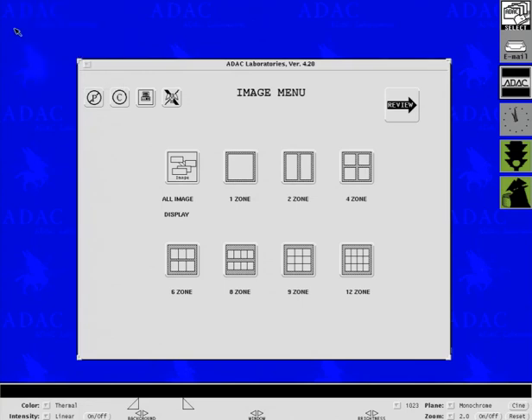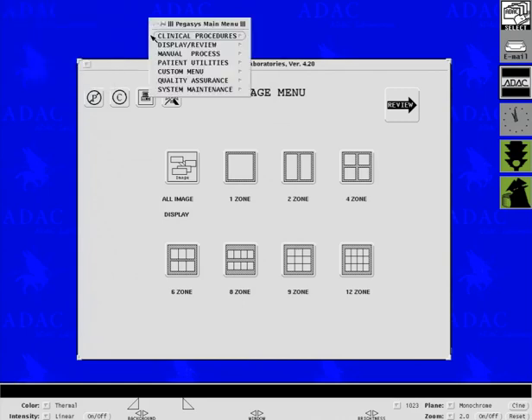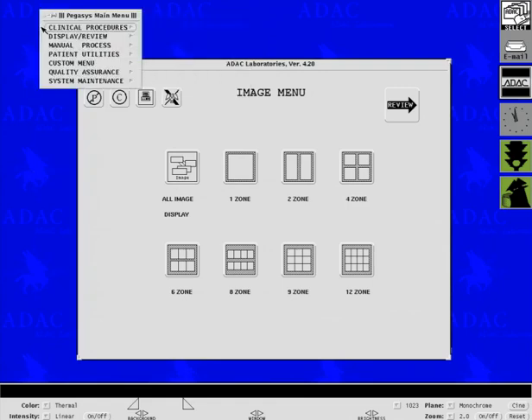The way to get to it is you right click in the background. When you right click in the background, you're going to get a menu. Now, you just want to tap your right mouse button. Just a momentary tap. If your mouse is acting finicky, bouncing, the switch is debouncing, the menu can show up and then disappear. But for the most part, you just want to right click quickly.